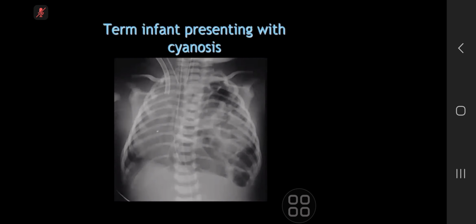So this is a frontal chest radiograph of a term neonate. Just in terms of tubes and lines, there is an appropriately sited endotracheal tube. There is an NG tube, which I can see passing just below the diaphragm, terminating around the level of the left pedicle of L1, and there is an umbilical catheter, although without the abdomen I can't see where that goes, as well as a right internal jugular line.